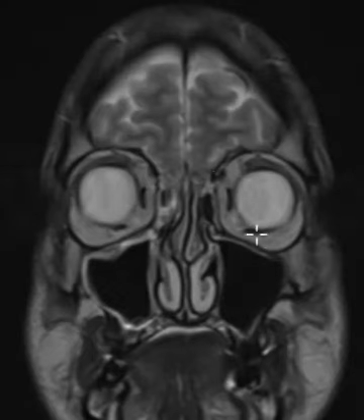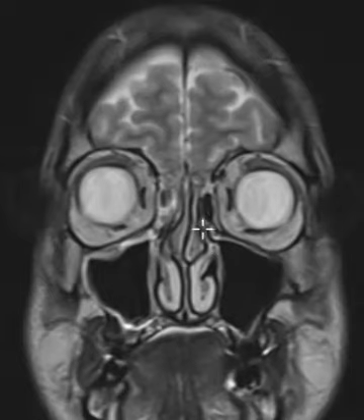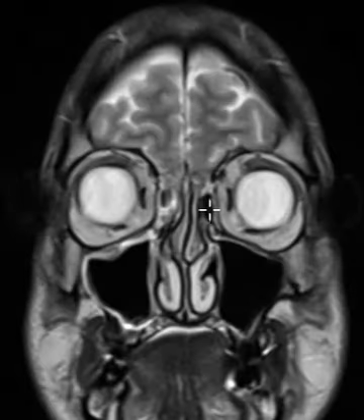So one other finding here, we can see he has a left maxillary sinus that looks normal. Air is black, so you have black air in there, and there's a little narrow channel. This is called the osteomeatal unit, and that air is a little air cavity, and it comes through and communicates with the ethmoid sinus here. This is an air cell in the ethmoid sinus that's dark, filled with air, and here's air, and you can see that little tiny channel, that little communication there. So this is the left osteomeatal unit, which is open, providing communication, equalizing the pressure between these two sinuses.